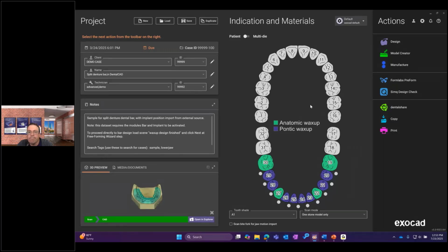So, and I should just note to everybody, if you guys are testing, first off, thank you for testing. The support team and definitely the development team are looking for feedback. So if you see a behavior that you don't quite agree with, understand, or you're having any issues, please save a scene file, and then have those ready to submit to our support team.